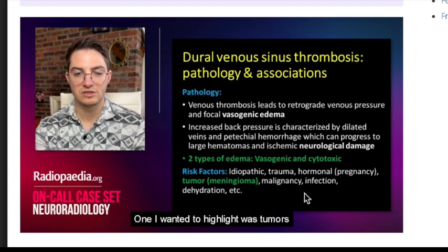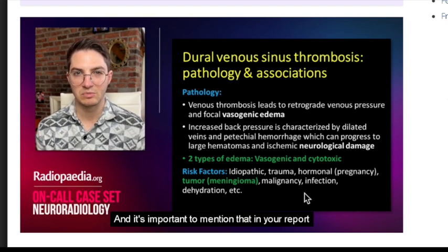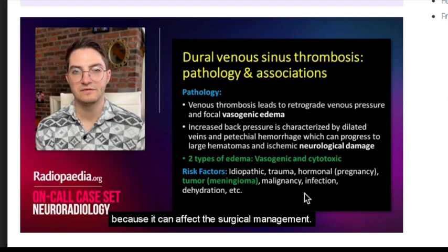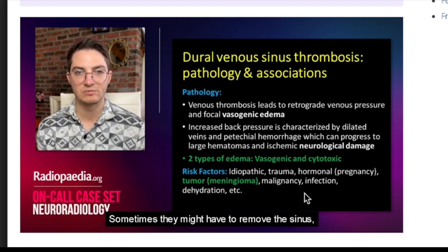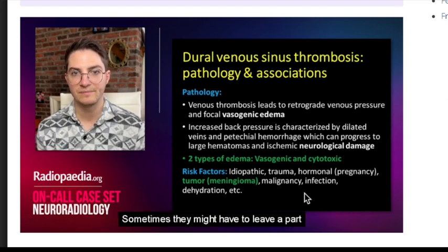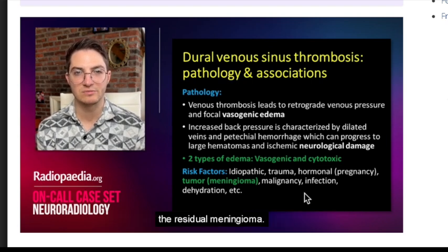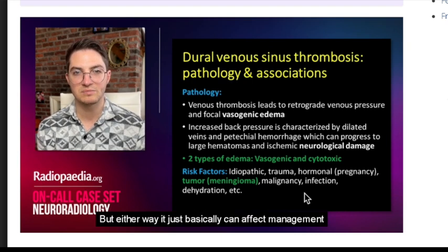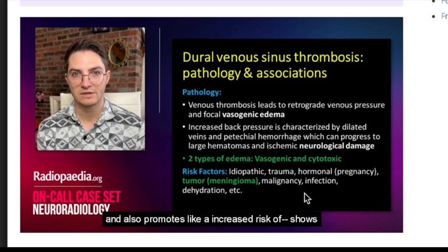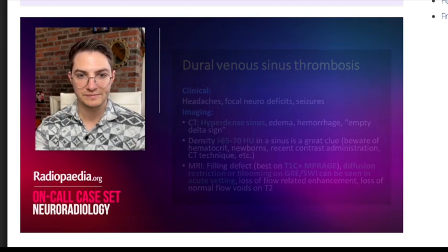One I wanted to highlight was tumors, and particularly meningiomas, because they're extraaxial. They often are near the sinuses, or they can invade the sinuses, and it's important to mention that in your report because it can affect the surgical management. Sometimes they might have to remove the sinus, sometimes they might have to remove and then reconstruct it. Sometimes they might have to leave a part of the meningioma and radiate the patient afterwards, the residual meningioma. But either way, it can affect management, and it also shows that there's an increased risk of venous infarction for the patient in those cases.